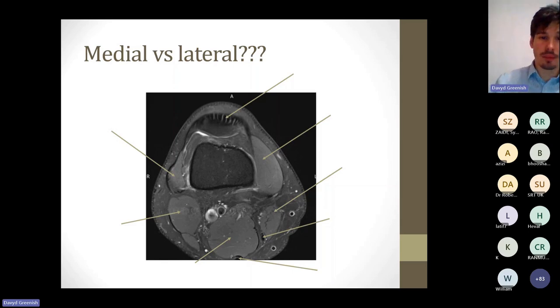Yeah, perfect. Quadriceps tendon. And then if we go for medial or lateral structures, I would say there are more things on the medial aspect here, although that might be slightly hard to say. This muscle here is bigger, which would be a giveaway for me. So I would say there are more muscles overall on this side and tendons. So does anyone know, if I say go for this side of the knee, is this medial or lateral? Yeah, perfect, spot on. So vastus medialis from the medial aspect of the knee, and then you can go through sartorius, gracilis, semitendinosus again, semimembranosus sat in front of it, biceps femoris muscle, and vastus lateralis.